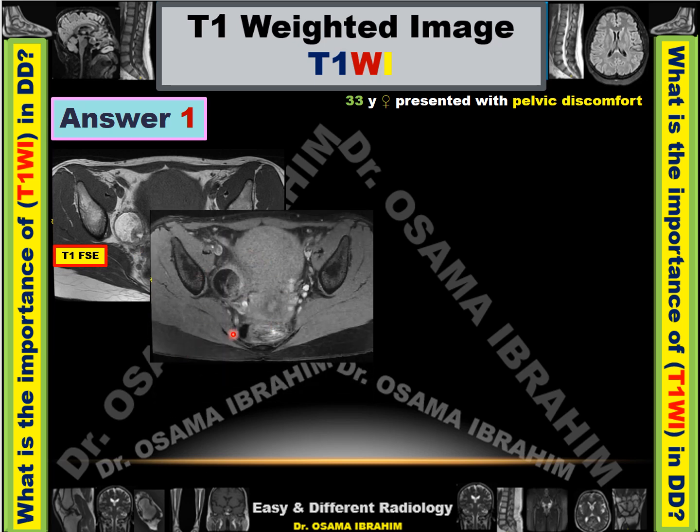So I will go to the best friend MRI sequence of the T1, which is called the T1 fat suppression sequence. T1 fat suppression, why? Because subcutaneous fat is dark, suppressed, and the urinary bladder still has low signal. What about the lesion? The lesion also appears with suppressed fat signal. So this confirms the content of this lesion is fat, with another heterogeneous component.